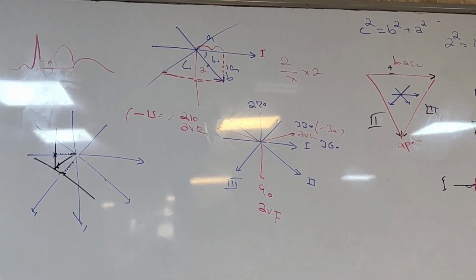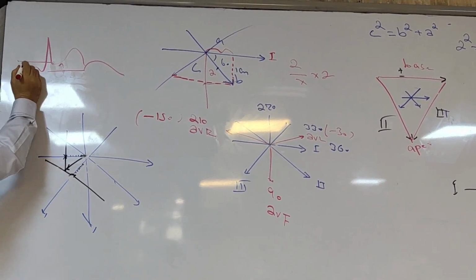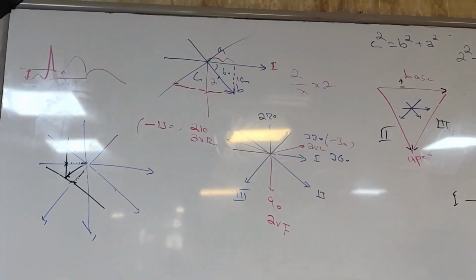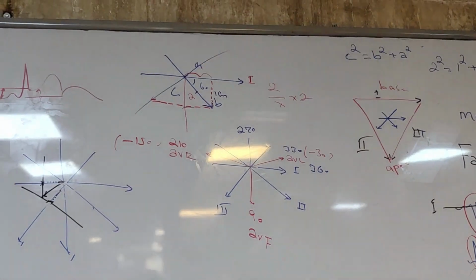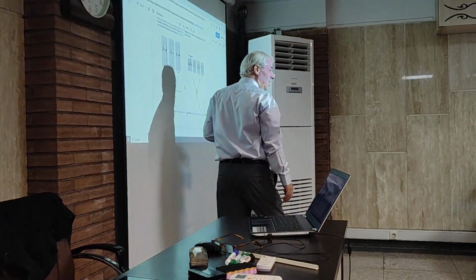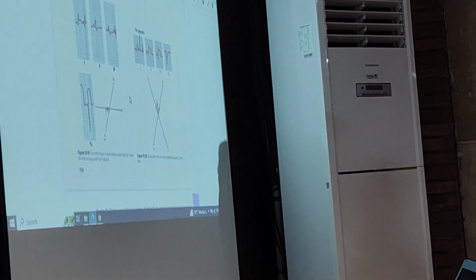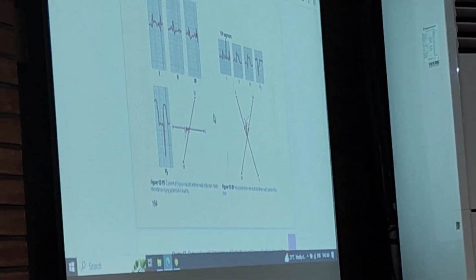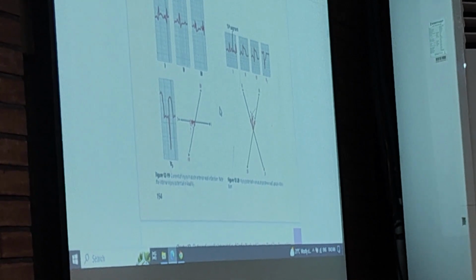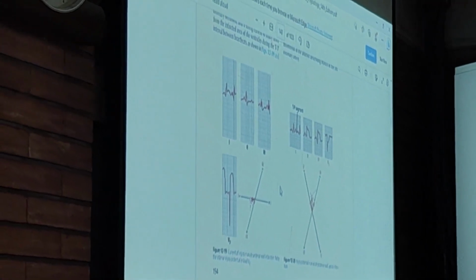But here in Guyton, you should make a perpendicular line at the end of S and then make a resultant vector to interpret it. But in clinic, who are working, take a look at this one. You have an ST elevation in V2. It means something abnormal in the anterior wall of the left ventricle, means myocardial infarction. ST elevation signifies acute myocardial infarction.